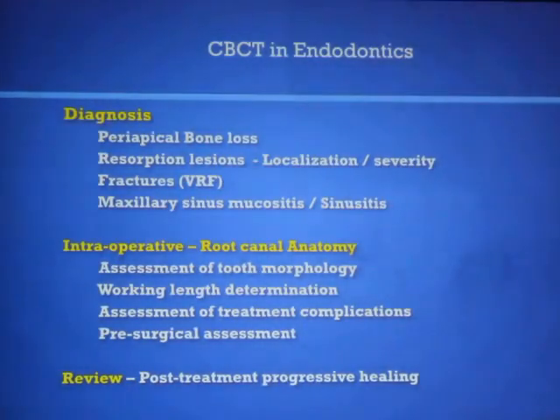So just to summarize everything, we've just seen the uses of conebeam CT in endodontics for diagnostic reasons, for the actual diagnosis of periapical areas, to diagnose and localize and check the severity of resorption lesions, and to check fractures and maxillary sinus infections.